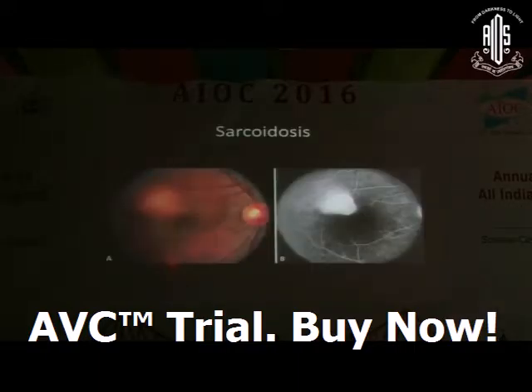Next is sarcoidosis. This can present in an umpteen number of ways. It can cause vasculitis, it can cause granuloma, it can cause new vessels on the disc and elsewhere. And here it is shown as a granuloma, which is becoming hyperfluorescent in the angiogram.